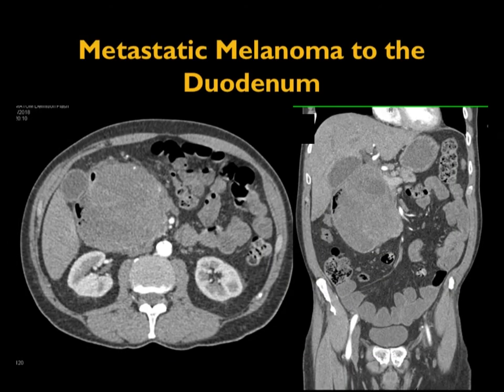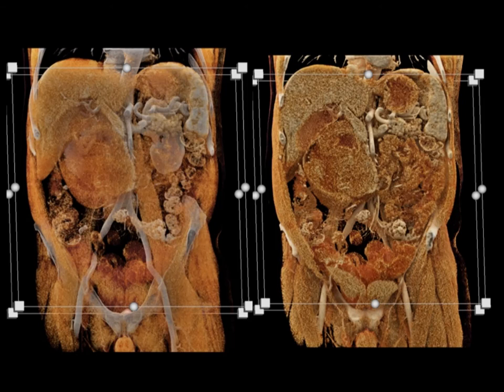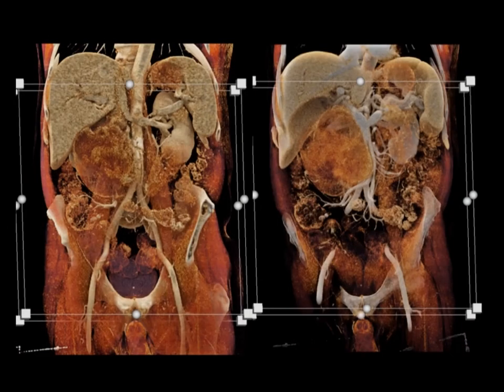And I mentioned we see it all the time. Here's another case I just saw. Look at the size of that mass invading the duodenum, very nicely shown. There's mottled attenuation, areas of hemorrhage are present. Here it is on the cinematic, beautiful example involving the SMV, the encasement and necrosis of the tumor. Very nice example. And if you look carefully, you can see things like bowel obstruction.